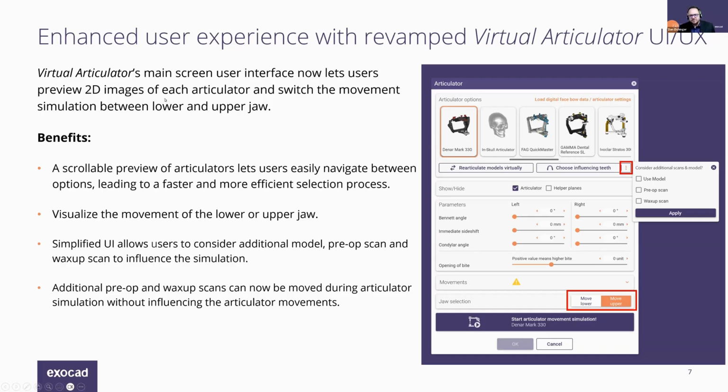So some of the features that have been added is to choose which jaw is doing that simulation to be more relatable to our anatomical situations.